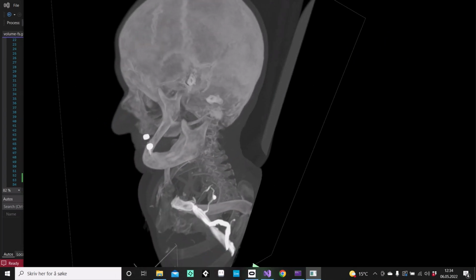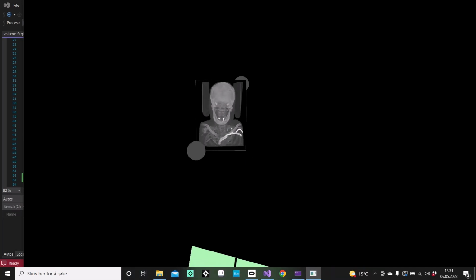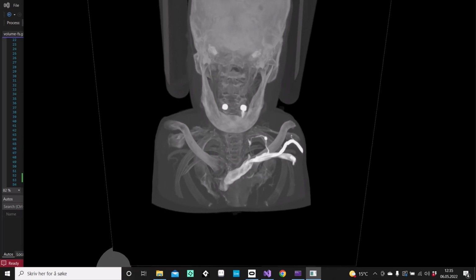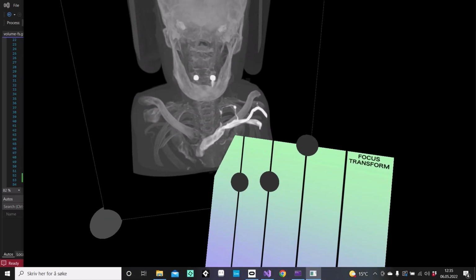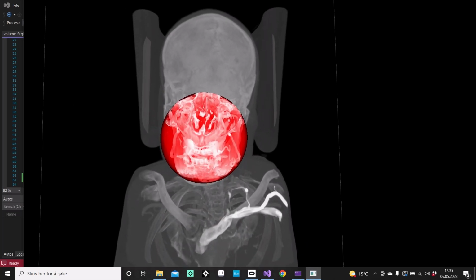We can move and rotate the selection easily using our controllers. We can also scale it. This is very intuitive in extended reality and one of the highlights of using it. I wanted to make a search tool that takes advantage of this spatial control, something that would be fiddly to use in a typical two-dimensional application.